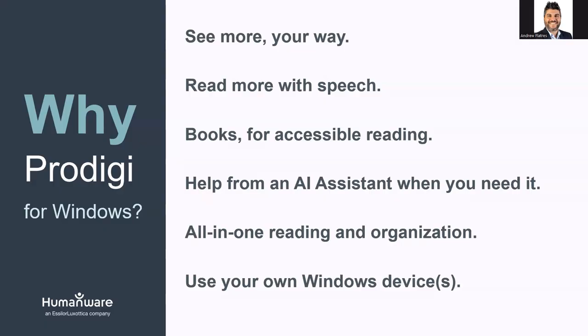We want you to be able to read more when you need to use speech. So we want to turn printed pages and text, or files of many different types, into readable text that you can listen to with text-to-speech. And then, of course, adjust that speech using a voice that you find comfortable, adjust the reading rates, and those types of things.